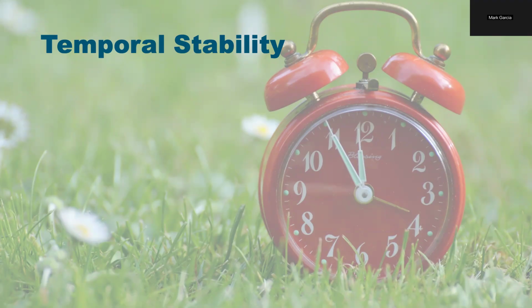The other thing to think about is temporal stability. So, benign early repolarization will not change. It's not going to evolve over the next 20 minutes or 30 minutes or an hour. However, obviously, a STEMI will change. That's why you get another ECG after 10, 15 minutes, just to see how it's changed. So benign early repolarization has what we call temporal stability.